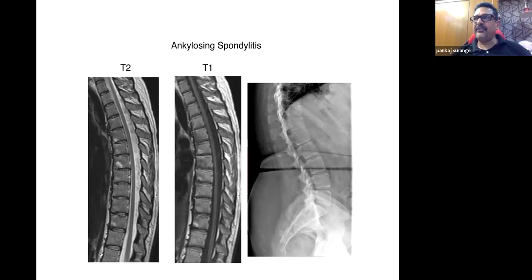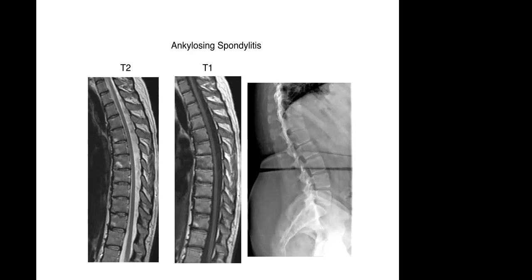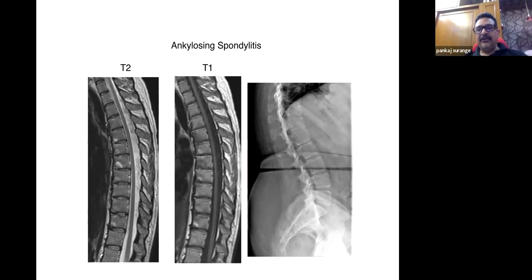Everybody knows about ankylosing spondylitis by now. You must have seen cases also. What we see at times is all types of changes in the spine. When we see the MRI of the whole spine, in some areas, especially in the lower part, there is sclerosis. As you start going upwards, we may see some fatty infiltration in the lumbar or lower dorsal region.